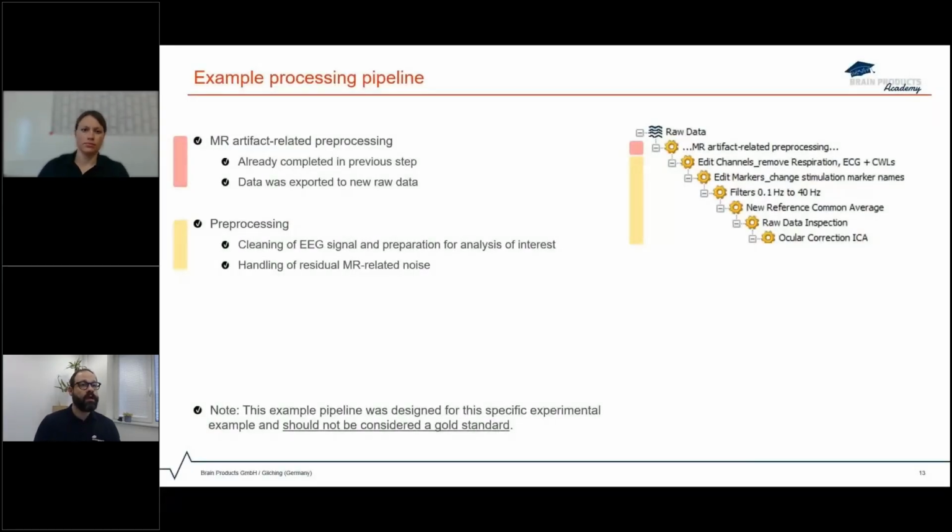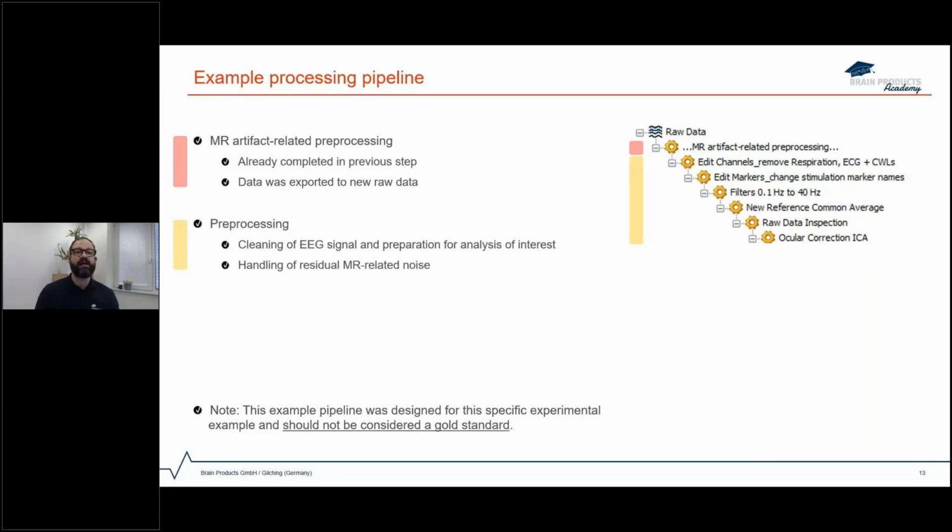Okay. Good. Let's actually start where we ended with our processing pipeline. In the last session, we talked about the pre-processing of the data. However, now we also have to look into what came afterwards. So we're having an ERP analysis here. And before doing the fMRI-informed EEG analysis with source analysis, we actually need to have our ERP analysis. I have already prepared this too, and as in the past session, I will talk you through it.